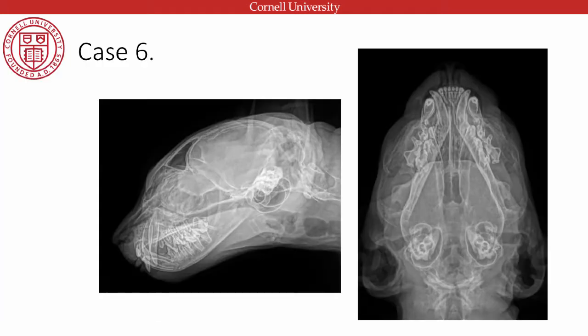This is her skull. This is another way, if you're querying osteopenia, it's good if you get a skull radiograph, you can have a look and see what the dental opacity is compared to the adjacent bone. Because dental opacity is always set in stone and doesn't change, whereas bone opacity can vary. In this case, she's obviously very young, but the teeth look very opaque in relation to the mandible and maxilla. So she has those classic floating teeth going on as well. So definitely a diffuse osteopenia going on.